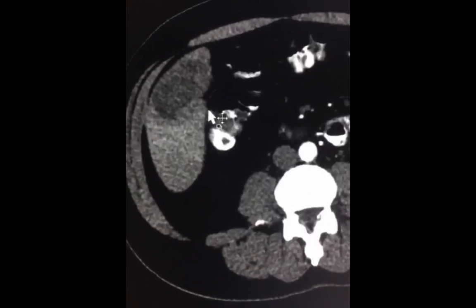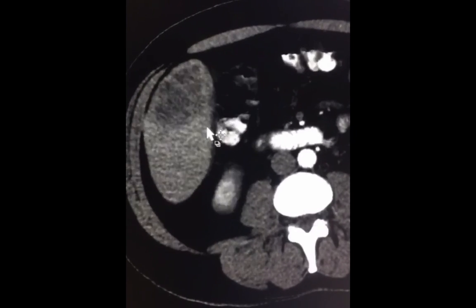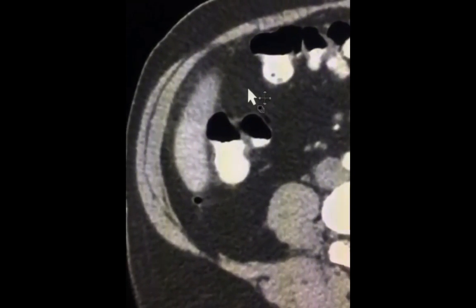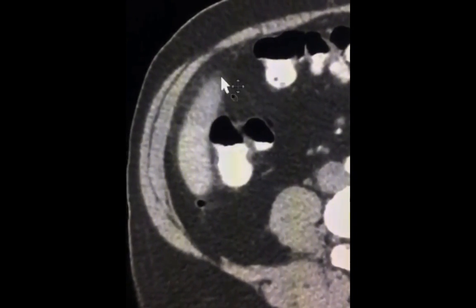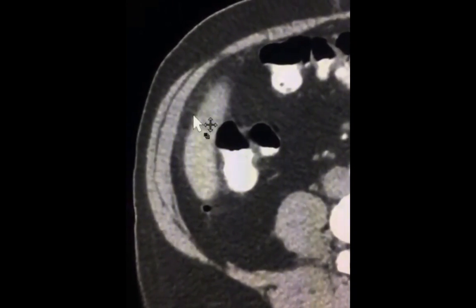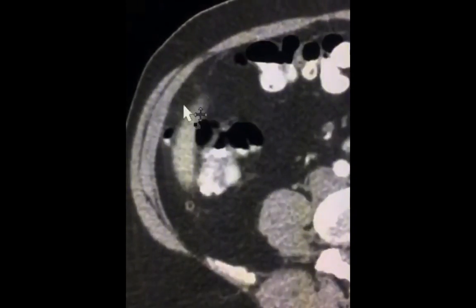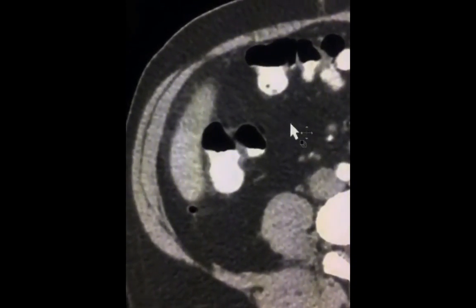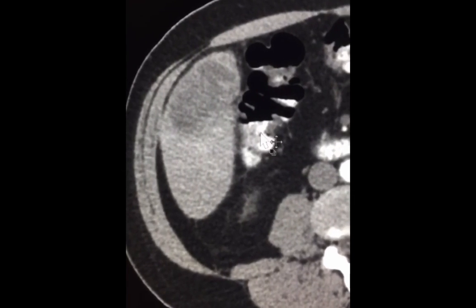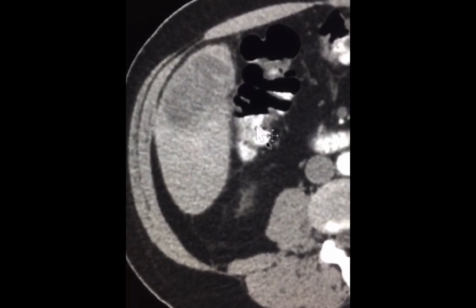The third observation, which is very subtle, is that there is enhancement surrounding the lesion on the arterial phase, suggesting inflammation in the form of hyperemia. Another subtle observation is that the fat surrounding the involved hepatic area is a bit stranded and has linear changes. This is what we call fat stranding. Fat stranding is a sign of inflammation on imaging. Notice how the fat at the mesenteric side appears to be very clean and dark. So whatever lesion we're looking at has lots of features that are supportive of inflammation.